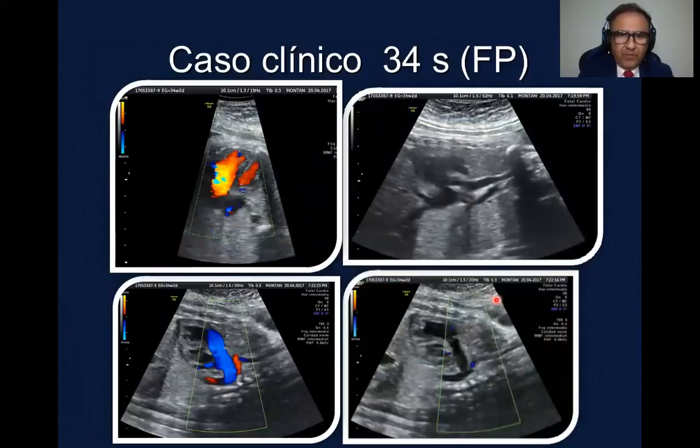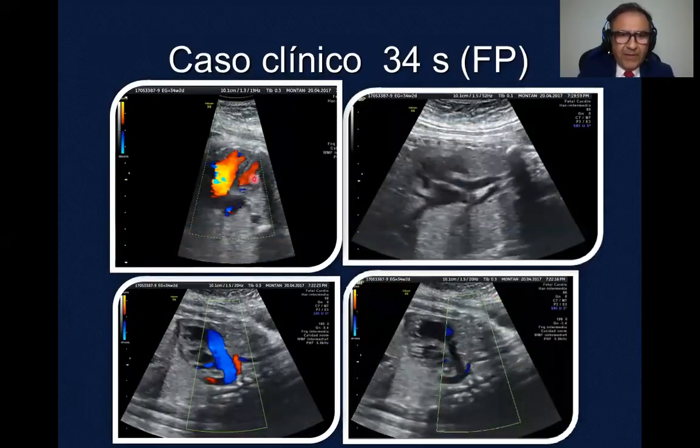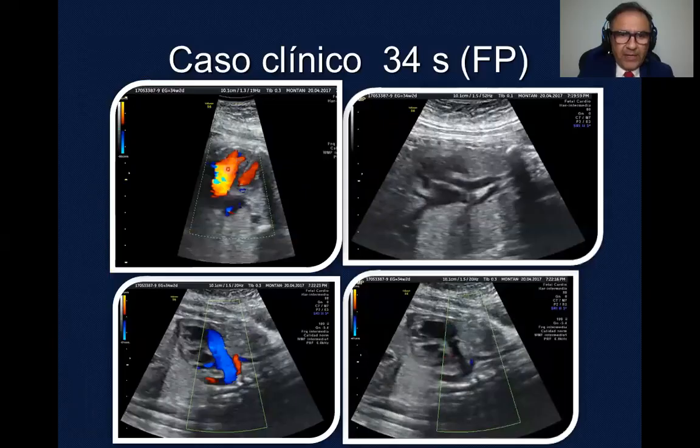Another false positive, four-chamber view, Doppler predominance, color filling within the right heart chambers, a smaller diameter ascending aorta, and it even had a more vertically appearing course. In the three-vessel and trachea view, there was a wide ductal arch with reverse flow in the aortic arch. Here it can be seen in grayscale, and the transverse aortic arch was practically not visible.